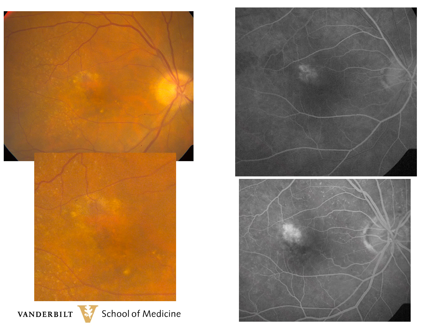The fluorescein angiogram shows early hyperfluorescence, which then grows in the later phases of the angiogram. The edges are diffuse and not sharp, and you'd be hard-pressed to say exactly where the edges of the neovascular membrane end.